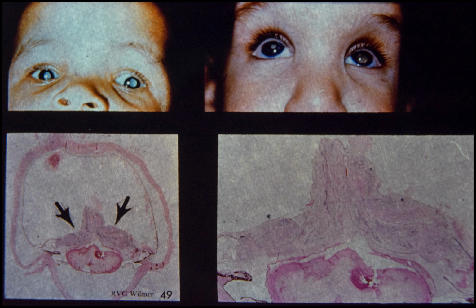Upper right, is another example of stage 5 bilateral cicatricial RLF. The child is totally blind. The right pupil is bound down to the lens by posterior synechia, and the iris lens diaphragm is bulged forward, shallowing the anterior chamber. The left pupil dilates normally, and the anterior chamber is normal depth.